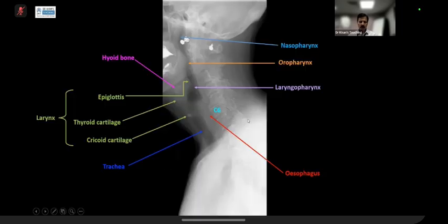So this is a barium swallow examination. And this will also tell you that, so candidate 1, you can see a barium swallow? Yes. Okay. So if you see, this is a barium swallow examination. This is a lateral view, and just to give you the anatomy. So there is air here, and this is the nasopharynx. You can see barium sitting here in the oral cavity. The patient has taken a sip.